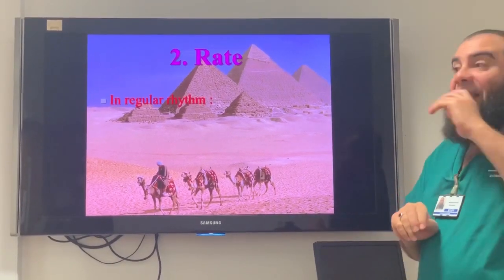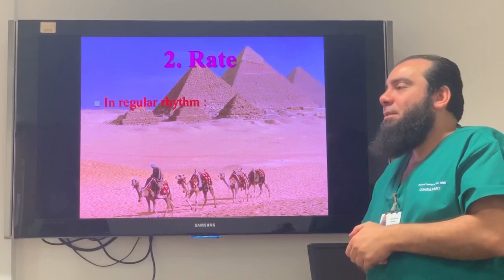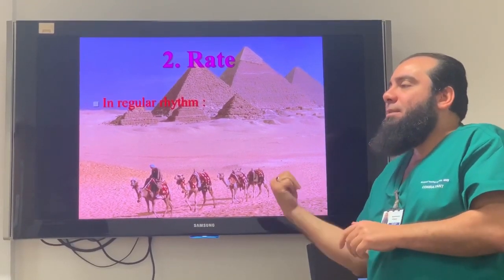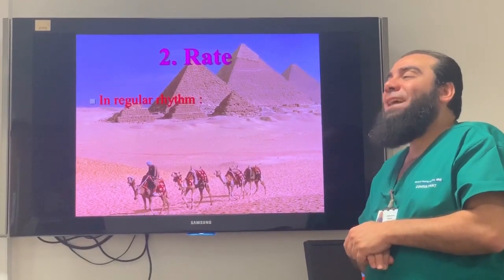Okay, someone doing 10 though. Simple way. 10 seconds. How many R's? How can I get 10 seconds in an ECG? From beginning to end, it's 10 seconds long.